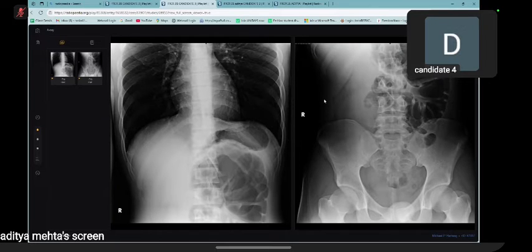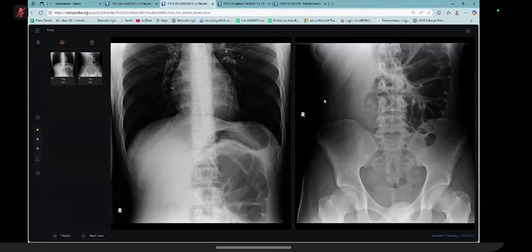In the next X-ray, the frontal abdominal radiograph, I can see again evidence of multiple bowel loops, which appear to be large bowel dilatation, as there is evidence of haustrations detected within the right upper quadrant of the abdomen. For me, it's giving the appearance of an embryo sign, which could be cecal volvulus, as I couldn't see any gas within the right side of the abdomen. I couldn't see small bowel dilatation, and also I couldn't see descending colon gas.